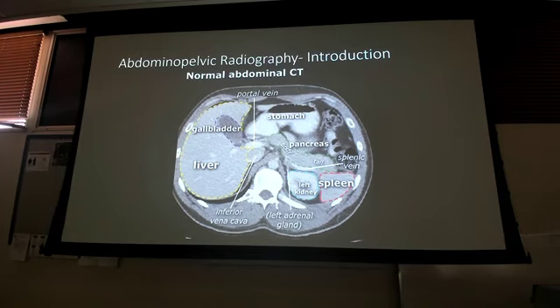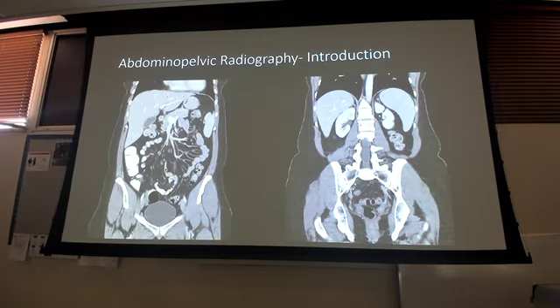So you will get practice in the lab. We're going to do what's called a CT scavenger hunt. I'm going to pull up actual CTs up here, and you guys are going to come up intermittently, and I'm going to be like, hey, find me blank. You're going to scroll through and put the pointer on there and try to find the anatomy I want you to find. So you'll actually get some practice scrolling through a real CT and a couple of them to try to find different things as part of the lab.